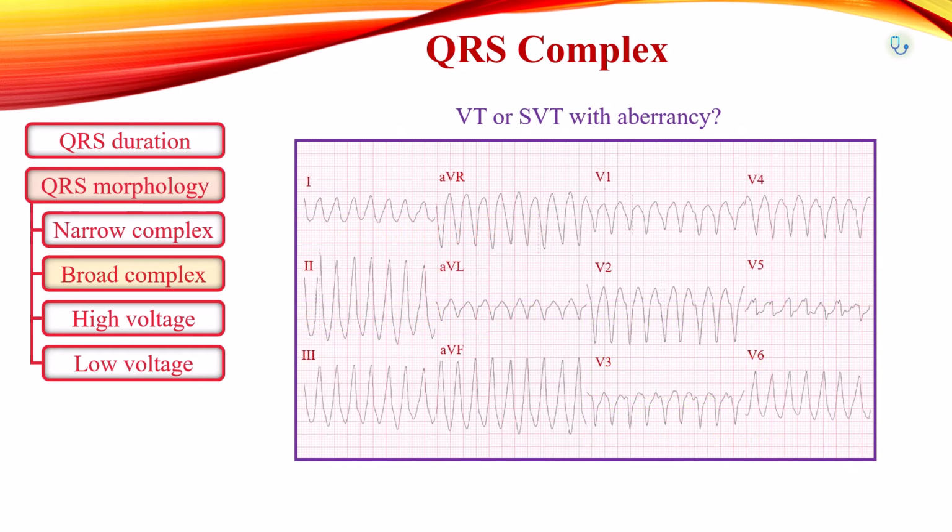Differentiation between ventricular complexes and SVT with aberrant conduction may be difficult. In general, aberrant conduction of supraventricular rhythms can usually be identified by the presence of atrial activity, such as P waves, flutter waves or fibrillatory waves. However, aberrantly conducted junctional complexes may appear identical to ventricular complexes, because both produce broad QRS with no atrial activity.